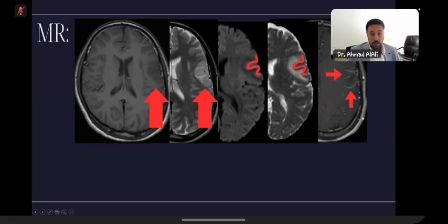In the post-contrast images, as you could see, there is some leptomeningeal enhancement going on, which also indicates the presence of an ischemic pathology. However, in cases where there is venous thrombosis and venous infarct, the behavior of the brain in the MRI and CT scan will be slightly different from that in the arterial insult. So you can see some leptomeningeal enhancement earlier than in arterial insult.